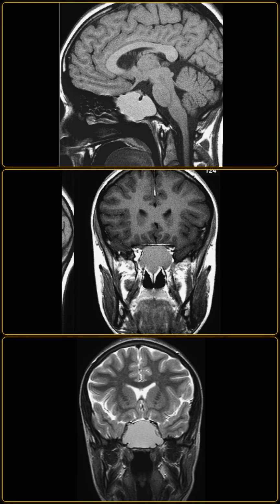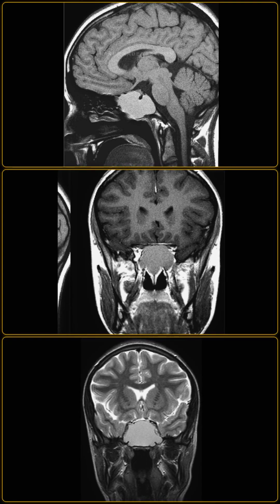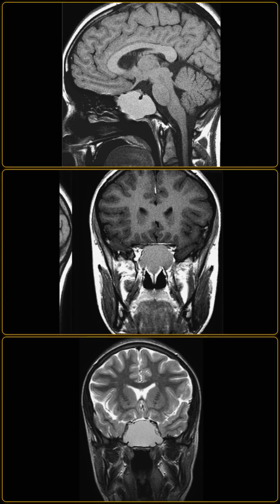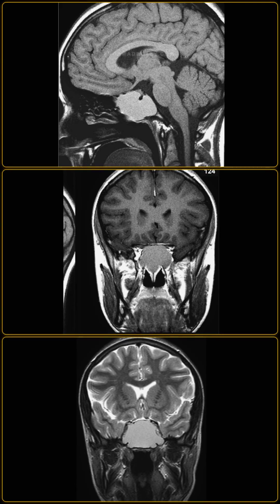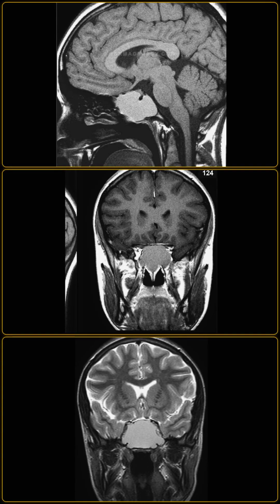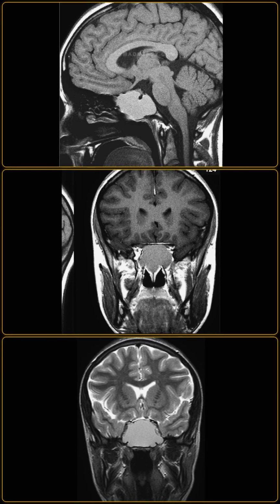The MRI signal intensity varies dramatically based on protein concentration and hydration state. Early, watery mucoceles are low on T1 and high on T2, whereas protein-rich or dehydrated chronic mucoceles are T1 hyperintense and can be T2 hypointense, sometimes mimicking a solid mass. What are the roles of CT and MRI in assessment, and what is the treatment for this patient?